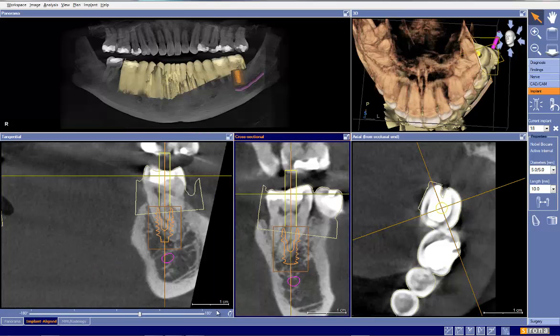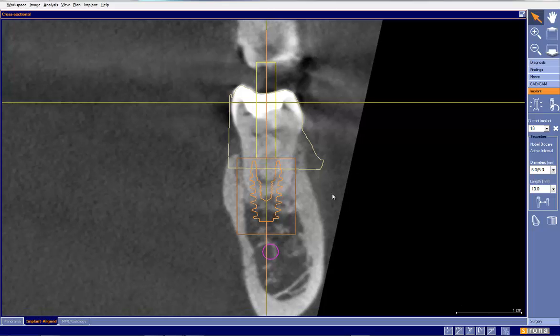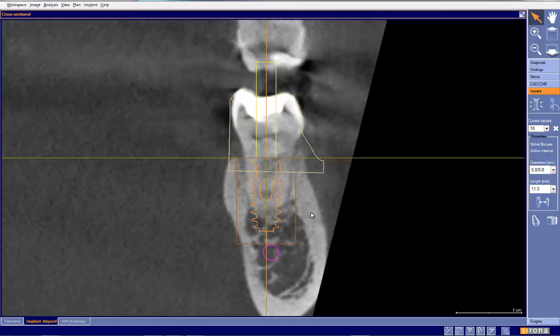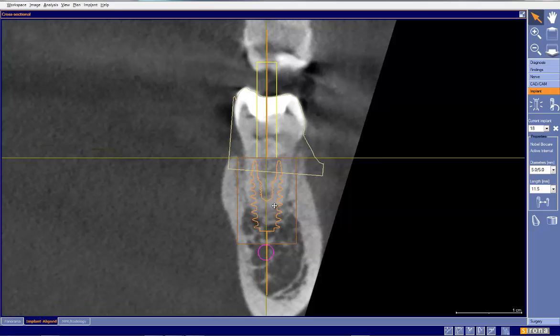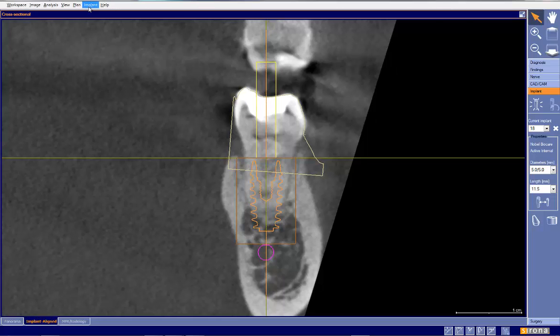Now, if we take a look at the buccolingual placement, after I've moved it, it's pretty nicely done. Let's go back to the original, and I would say here we're good, but we have the ability to center this a little bit more like so. So I would prefer to see something along those lines if possible.